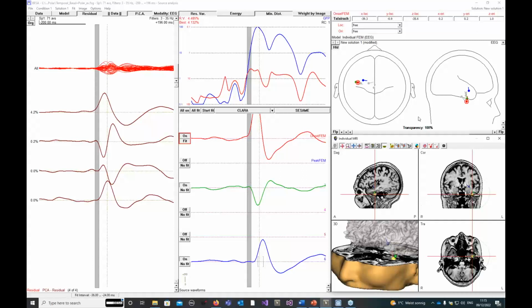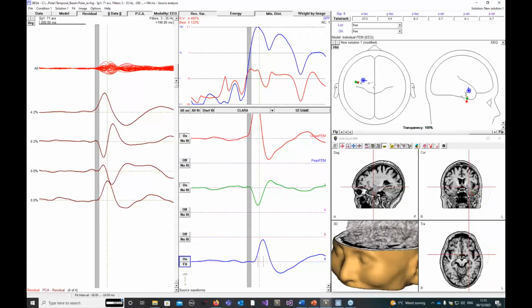So in this case, especially if we go to some deep sources or low sources like at the temporal lobe tip, it's quite important to have accurate head models to get good localization results. Even though, okay, to not completely put down the spherical model, we also have to say that all of these ended up in the same brain sublobe. So that is one thing we can achieve. But if we want a real accurate source localization, we should go for a realistic head model.